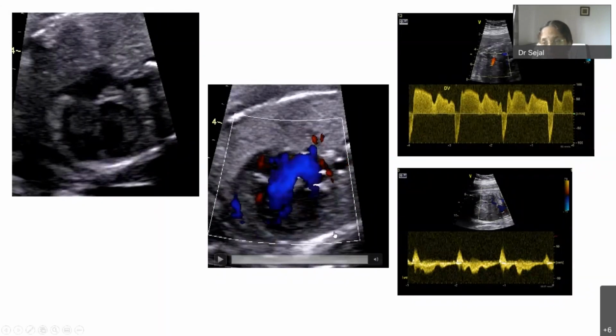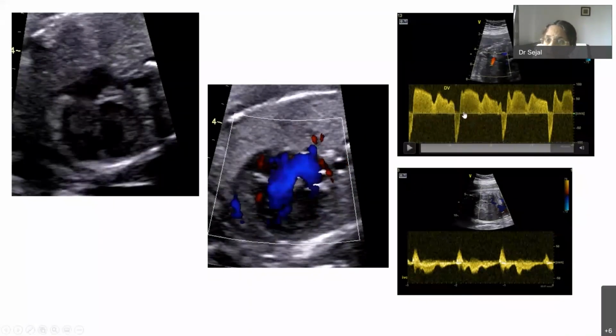Now, this is just one example of a ductus venosus Doppler. You can see here beautifully the S, D and A waves, and the A waves are abnormal, obviously very prominent. But remember that in complete heart block, we cannot take this as a reflection of hydrops or cardiac failure, because the atria is contracting against a closed AV valve.